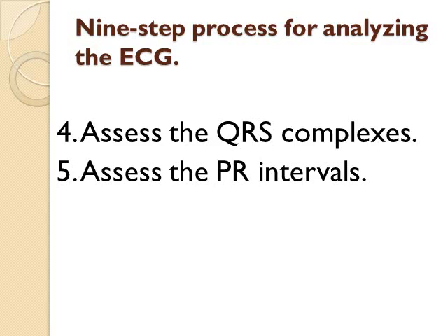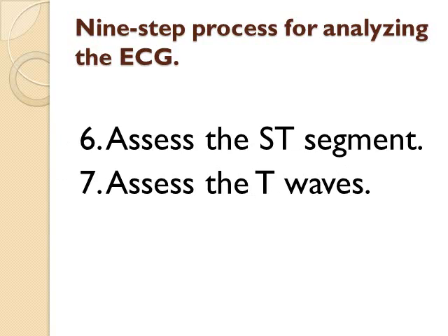Then fifth is assess the PR intervals. Are the PR intervals identifiable? Are they within normal limits? Is it constant in duration? Then assess the ST segment. Is it flat, or is it an elevated or depressed ST segment?